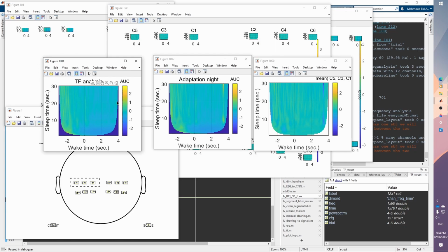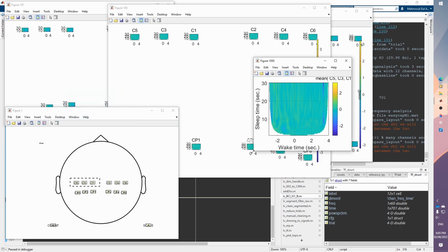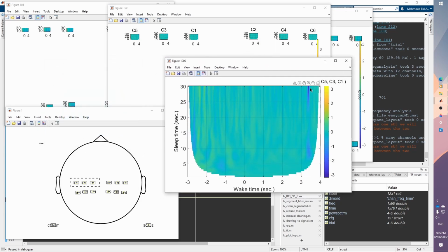Okay, and here we are looking at the difference. So that's condition 1, that's condition 2, and that's the difference. So that's condition 1 minus condition 2, and we can see this yellow part here. This was not existing here, so here it's minus, and here it's positive. So this minus this will give us a negative in this part. So that's nice to look at in our data, and that's perhaps something happening in this frequency.